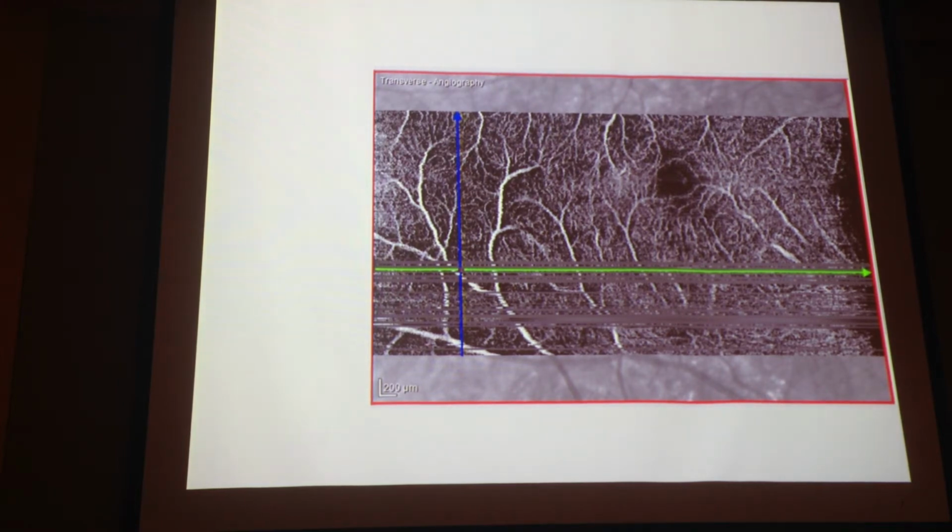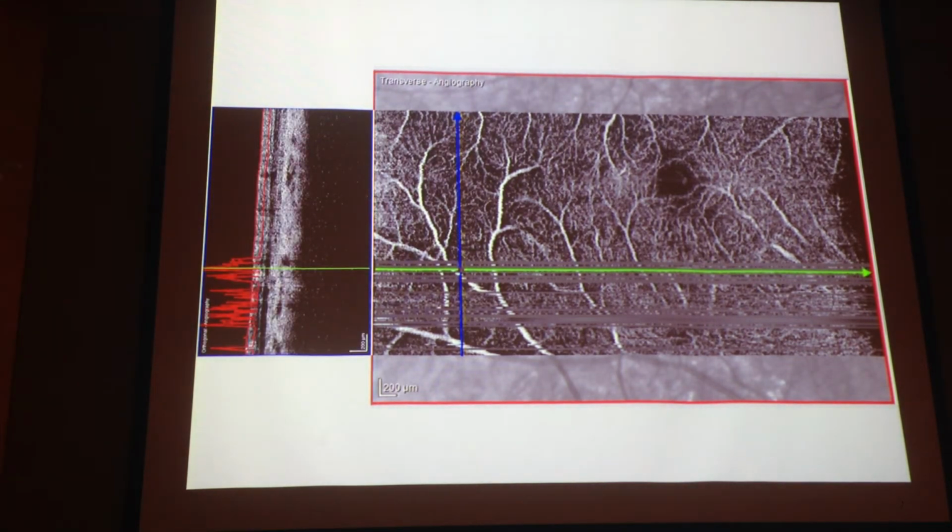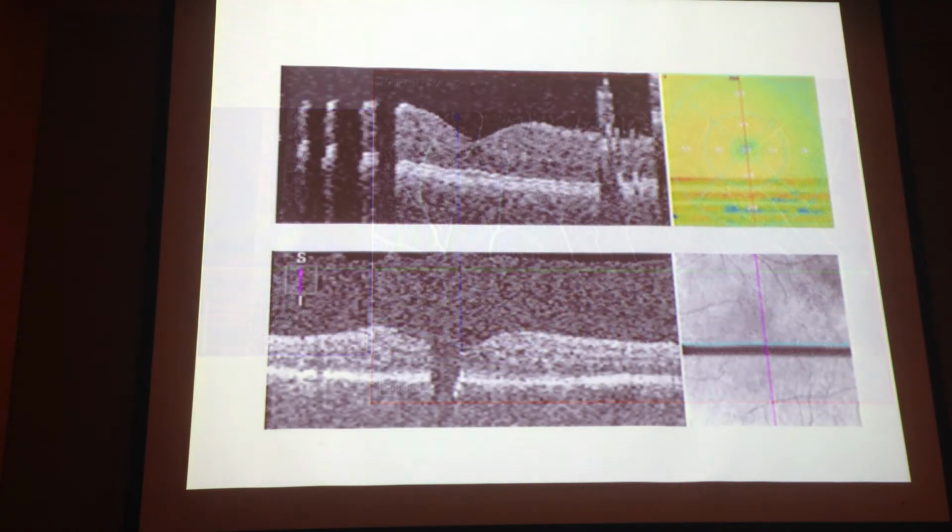With the Heidelberg, it can take 3 minutes right now. So it's quite a different thing. But you see, there are some artifacts there, and it's only the fact that the segmentation was not correct. So there is a series of artifacts. Of course, everything will be solved in the future, but right now you have to consider all these things.